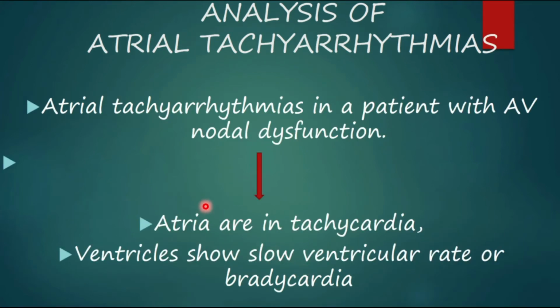Therefore, in atrial tachyarrhythmias in a patient with AV nodal dysfunction, atria are in tachycardia, either atrial fibrillation, atrial flutter, or atrial tachycardia. Ventricles show comparatively slow ventricular rate or even bradycardia.